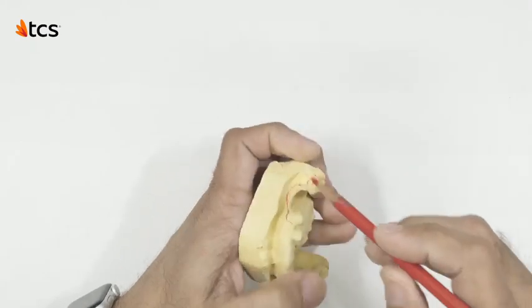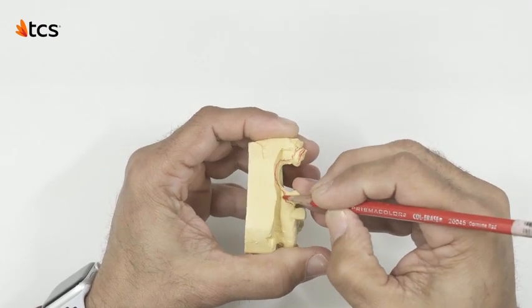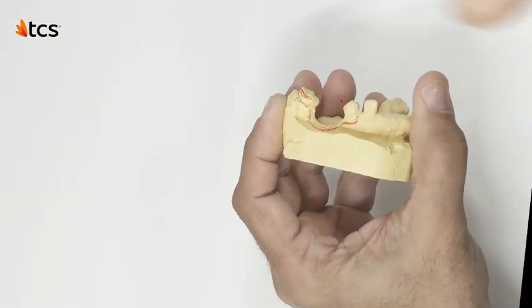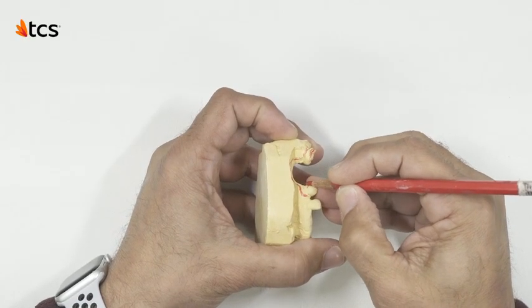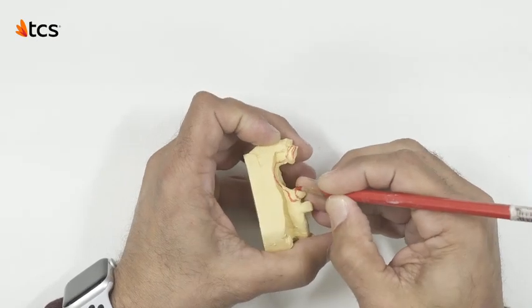As mentioned in previous demos, following the height of contour of the bone on the buccal flange design portion of the case is fundamental for comfort. In this case, this premolar is thicker on the top and slimmer on the bottom. Therefore, engaging the neckline below the high point as opposed to the 1 to 2 millimeter design rule will allow an easier path of insertion.